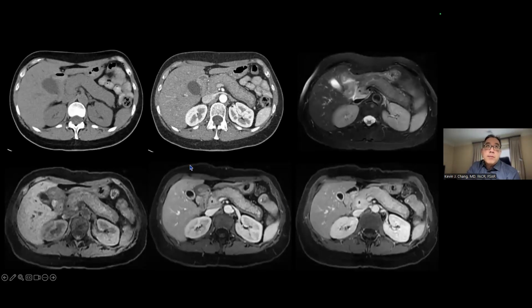I'm showing you another example here. Multi-phase CT, pre and post contrast CT here, showing you that diffuse swollen appearance of the pancreas, loss of that feathery soft tissue and fat appearance of the pancreatic parenchyma with a relative smooth margin, which shows what looks like an area of differential enhancement encasing the pancreatic body and tail here.